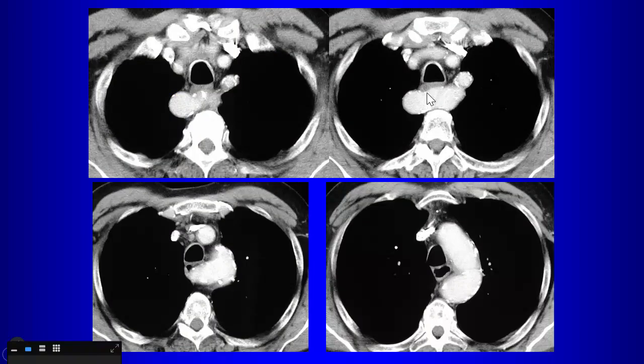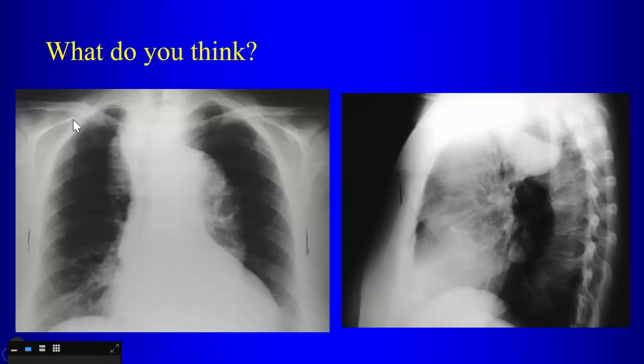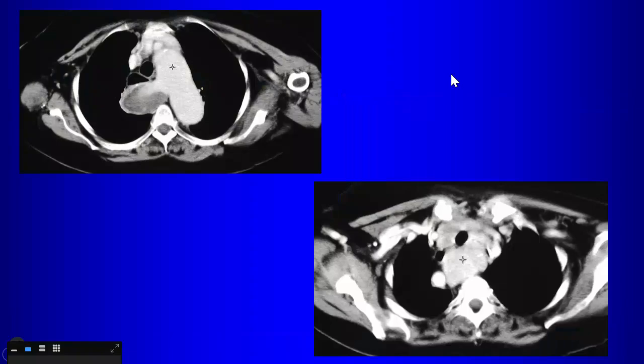Okay? And in some cases, especially if it gets aneurysmal, patients develop atherosclerotic disease, it gets hardening of arteries. This can cause obstructive problems in the esophagus. That is called dysphagia lusoria, right? So obstruction of the esophagus or dysphagia from an aberrant subclavian artery is called dysphagia lusoria. In this case, another aortic arch, big dilated arch, some big thing here, this time in Raider's triangle, and this is actually an aneurysm of an aberrant subclavian artery back there. Okay?